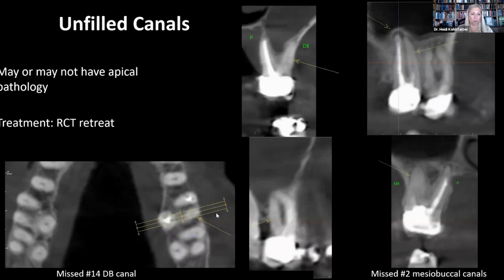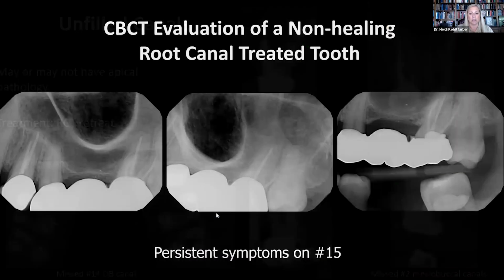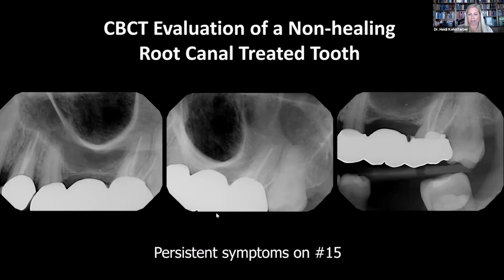So we can easily see unfilled canals. We see those all the time, day in and day out. So definitely something that we are looking for. So here is an example case. This came over from one of our endodontists. The patient had continued pain and drainage. It looks like all of the roots were filled based off of our 2D.